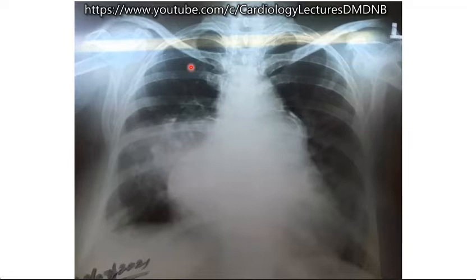So, does this patient have the ductus calcification? It's not seen, sir. Ductal calcification because What is this? Oh yes, sir. Can you see this? Yes, sir. This is a ductal calcification.